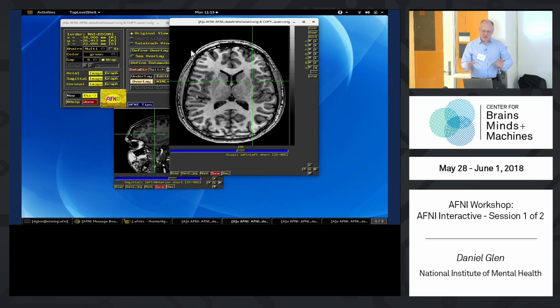Another point that I will bring up, although I'm presenting here at 1024 by 768, which is a miserably low resolution for using AFNI, I recommend using giant screens, or 2 giant screens, or 3, because you need a lot of real estate, visual real estate, to look at all your data. And we will quickly fill this up.